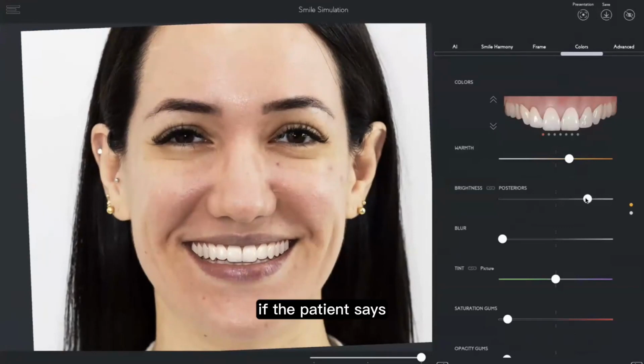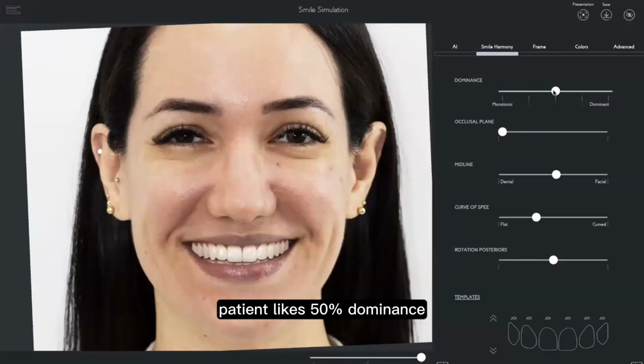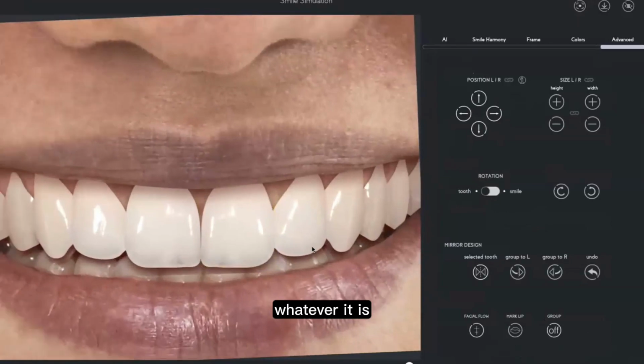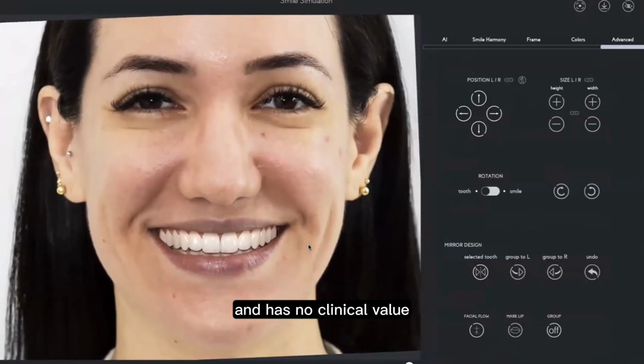If the patient says, I like the dominance, maybe too much, we can reduce the dominance by 50%, that's good, I like it. Now we have the most important information. The patient likes oval shapes and 50% dominance. That's it. That's the 2D smile design. We do have options to click on a tooth, move the tooth around, change the size, the width, the height, whatever it is. It doesn't matter, because this kind of smile is motivational and has no clinical value.